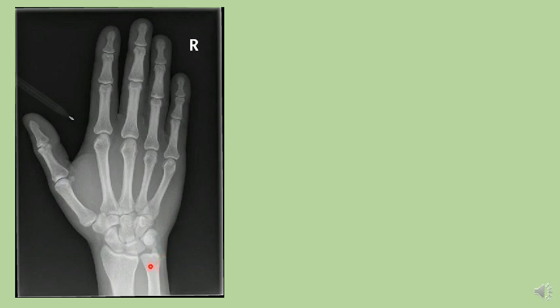He may ask you for identification of carpal bones. This is the radial side, first row: scaphoid, lunate, triquetral and pisiform. Triquetral and pisiform are overlapping here. You can see this P-shaped round dense shadow, that is because of overlapping of pisiform and triquetral. This is trapezium, trapezoid, capitate, this is the head of the capitate, and this is hamate, this is the hook of the hamate.